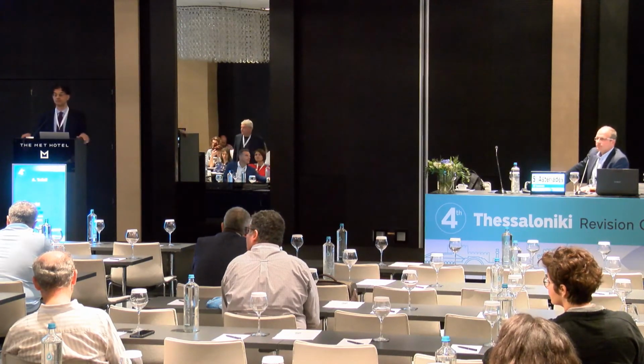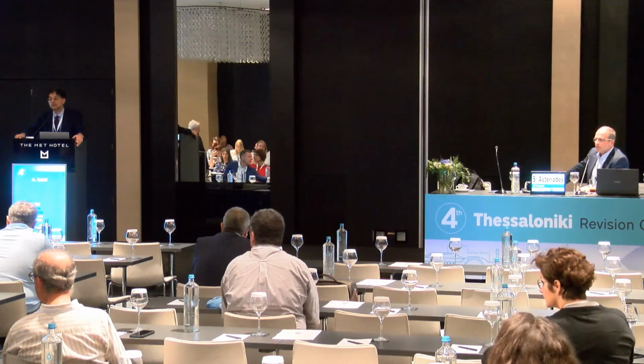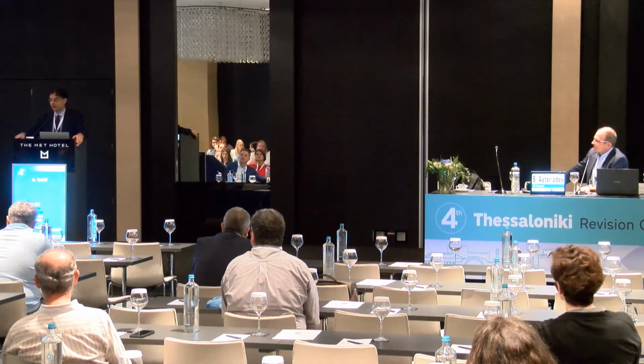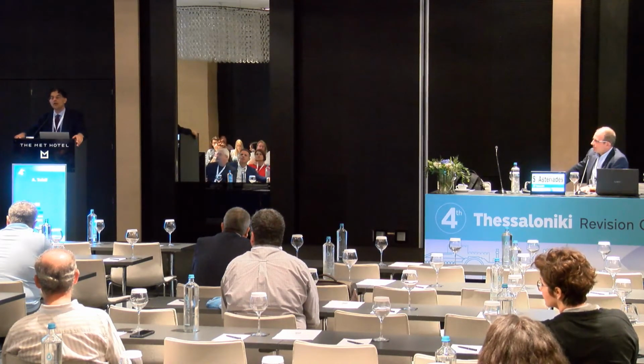I'd like to ask, this is the ultimate diagnostic test for PCVs. One word: ICG, SLO-based ICG with a video clip. Do we need to diagnose them? Okay, so there's two things.